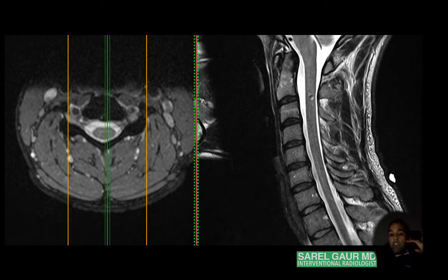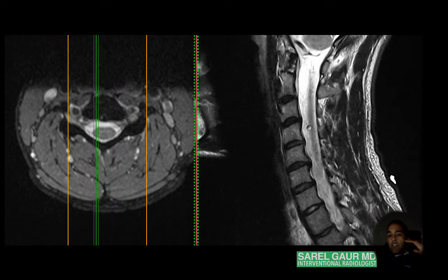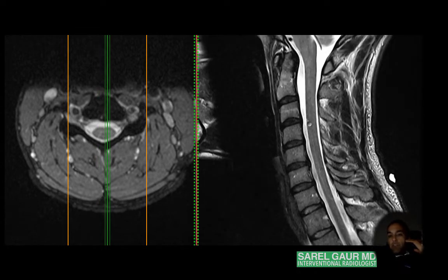We would see big cord tumors, which are very rare, but we'd see them. We'd see congenital malformations of the cord and the cauda equina. We'd see large metastatic lesions that are transspatial, that involve the column, thecal sac region, and posteriorly into the posterior elements. We'd see a lot of weird arthritis things with maybe large synovial thickening involving C1, C2.